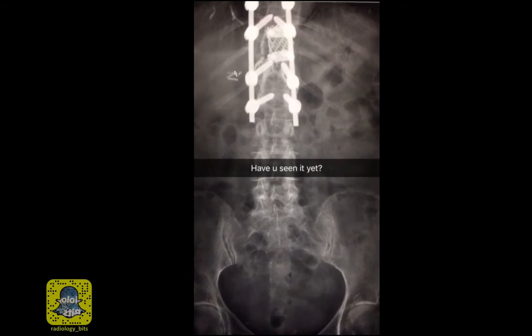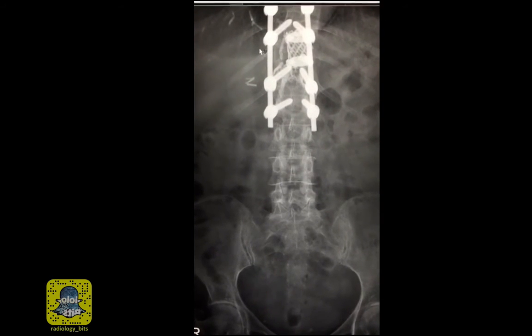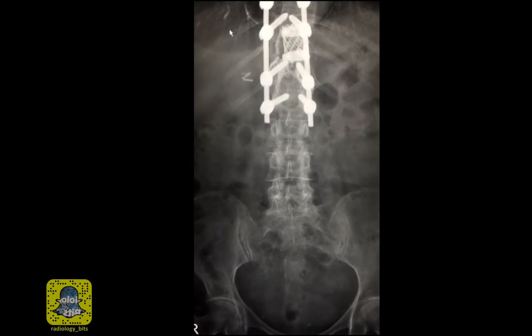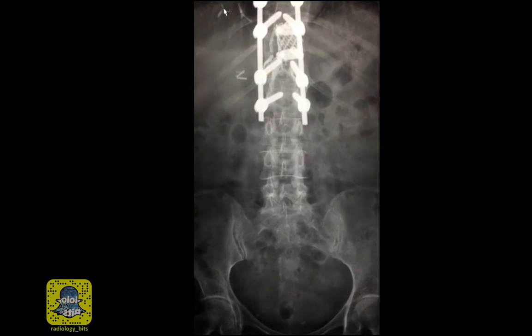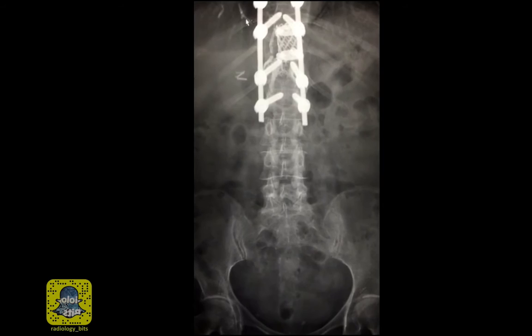Do you see any other thing that looks a bit unusual? Don't forget that the lungs are part of what you see on an abdominal radiograph. You don't see the whole lung, but you see the lower lungs, and looking carefully you'll notice that you have these linear, highly dense structures. So you have all those linear dense structures in the lower lungs.